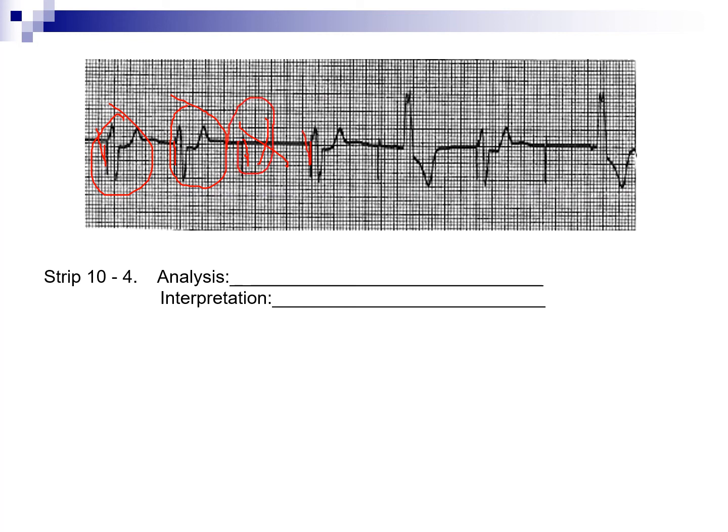You have a pacer, QRS, and you have a pacer, but no QRS. This QRS is the patient's own beat. So this is an intrinsic beat, which means it's the patient's own. Then you have another pacer, QRS, which kicked in. Then you have another pacer, but no QRS. So it failed to capture here. And then you have the patient's own beat. So we are seeing that it is failing to capture.